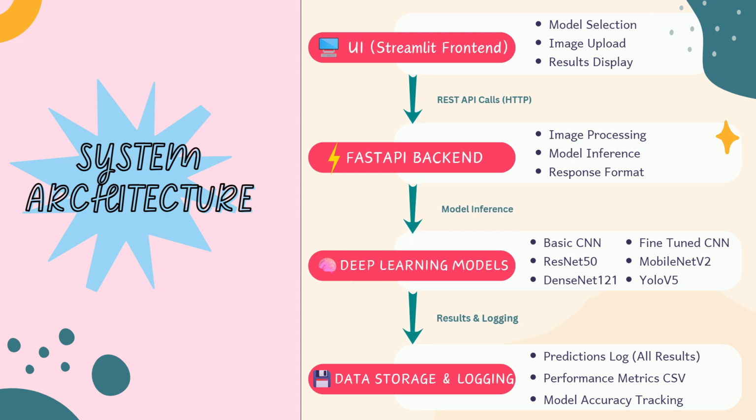I chose FastAPI because it's fast, asynchronous, and production ready. All six models stay loaded in memory for instant prediction. Everything is logged for performance tracking and continuous improvement. This architecture is scalable and deployment ready. The backend could easily be containerized and deployed on any cloud platform. Now, let's see it in action.